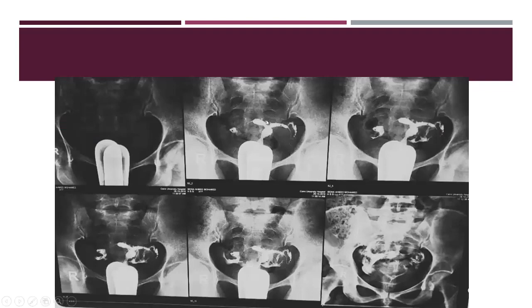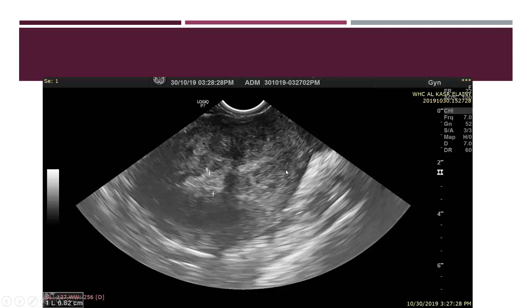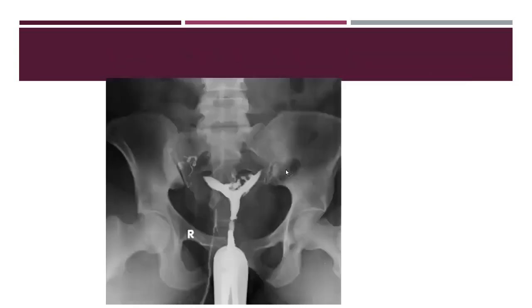This is typical for adenomyosis. This is the endometrial glands outpouching from the surface of the uterus. And this is cicatricial contraction mimicking duplicated uterine cavity. Again, typical appearance of adenomyosis.